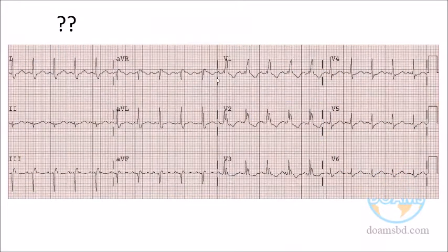Now come to this ECG for you. Who can identify? Please look at it. Don't be busy with any other thing. Be busy with the block only. Which block is here? Right bundle, left bundle, or other? Think yourself and give your answer. Raise your hand, please. Someone lowered their hand. Why?